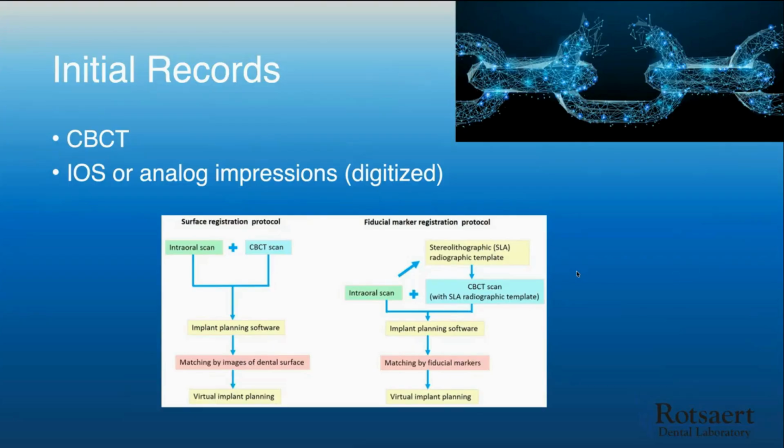The turnaround time is fairly quick with that, but we're able to then give you at least information. So if you have a consultation coming up with a patient, we can give you the yes, no, what implants can we place for the discussion with the patient. Then if we want to go to the point of a surgical guide, so something that either fits on tissue or fits on teeth, when they fit on teeth, like a night guard or a splint or an Essex, if you will, this is far more predictable or repeatable than necessarily on soft tissue. And I'll talk about that technique in a little while.